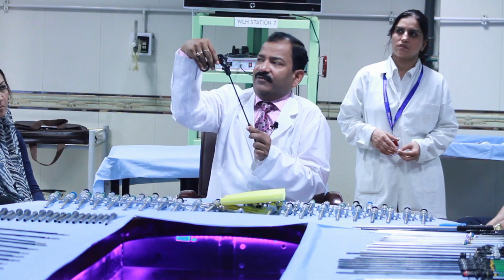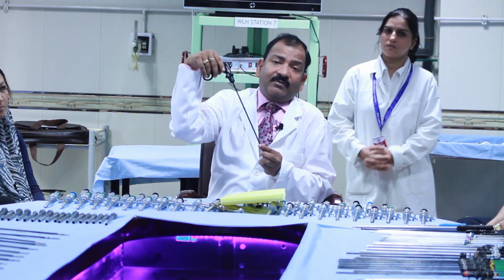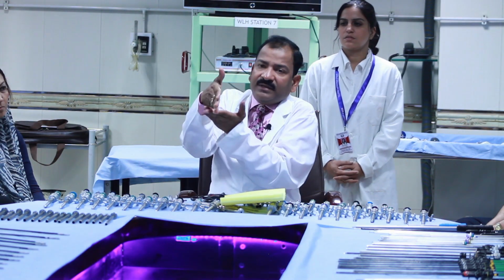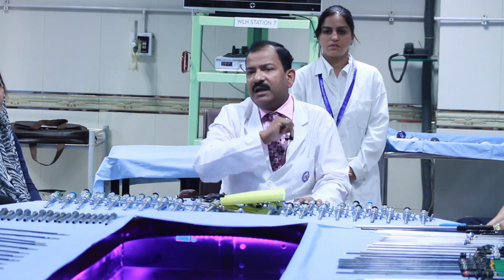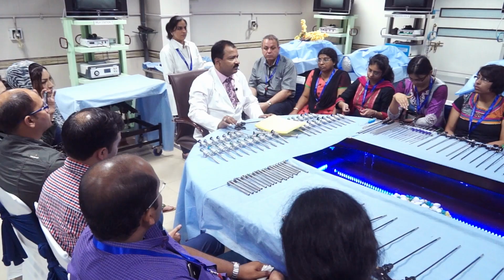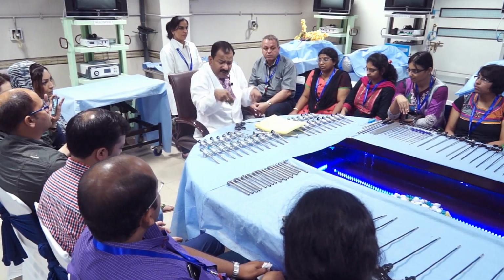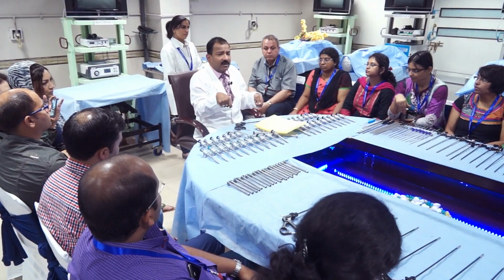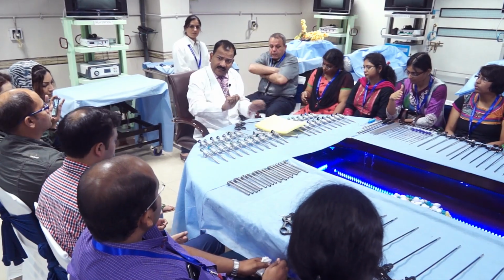We decrease this and we bend our hand, because I cannot keep it up for a long time. So I have to decrease it, and then bend like that. As soon as the angle between the hand and forearm is more than 15 degrees, any type of suturing or knotting is impossible. You cannot tie any knot, surgeon's knot, Miller's knot, anything. If you keep your hand like that, I do not think even in open surgery you will be able to tie your knot. You cannot do that at 15 degrees. You are always keeping it straight, even in open surgery.